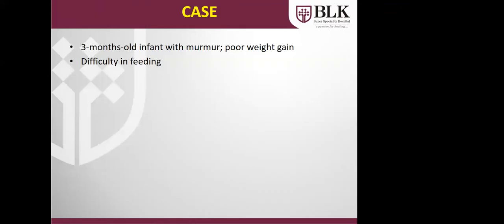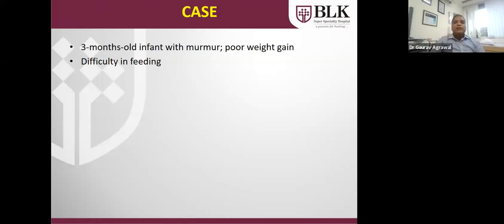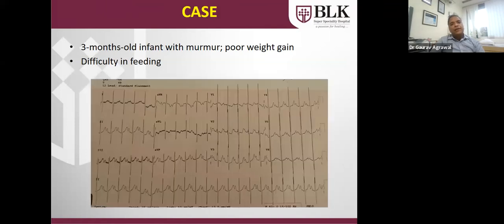Another patient, 3 months old, came with some murmur, poor weight gain, difficulty in feeding. The typical large VSD presentation is there. I am telling you the diagnosis. You have to tell me what is the finding in ECG.